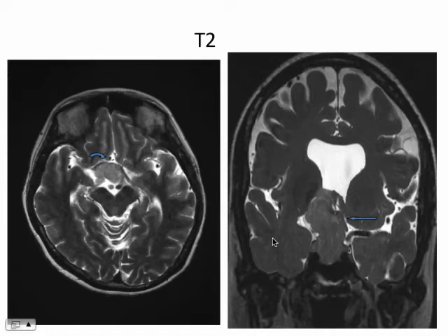And here on the axial and coronal T2 weighted images, you can really appreciate the degree of the mass effect that this mass is exerting. Here's the optic chiasm, and you can see that the optic chiasm is being uplifted, stretched, and draped. The morphology of the mass is such that it's having some more mass effect upon the right side. And there's also some increased T2 signal within the hypothalamus on the right side. Where is this? Right here.